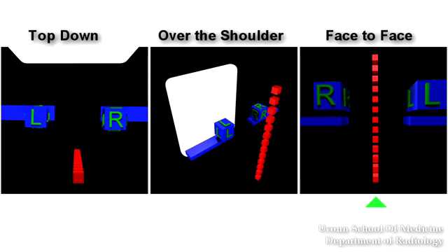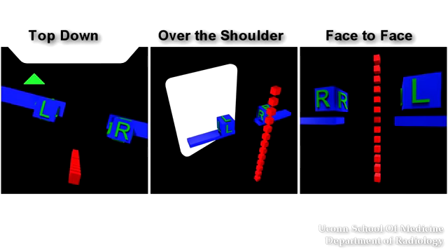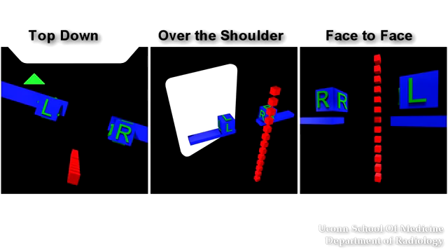That means the right clavicle is actually on the left side and the left clavicle is actually on the right side. Now notice what happens when we rotate the patient a little bit. So if we rotate to the left, meaning that the patient's left shoulder, for example, is a little closer to the image plate than the right.